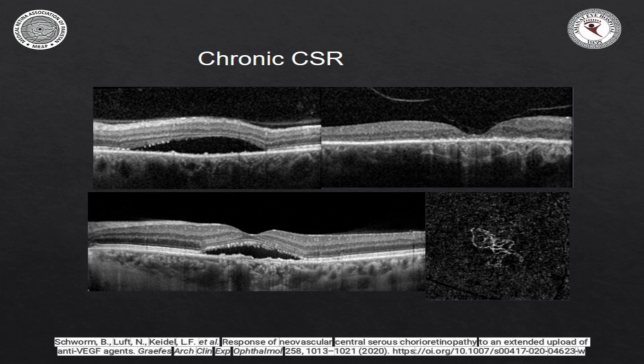And then you've got, okay, ठीक है, RPE irregularity भी मुझे नजर आ गई. In a patient with chronic CSR, be very, very mindful if this is not a developed CNV. So we know that chronic CSRs do develop CNV. They present to my clinic more often than I'd like to. And if you do a fluorescein, and for me, this is one of the very few true indications of getting an OCT angiography done. Because अगर इस पे आप fluorescein angiography करेंगे, तो you will get that subretinal hyperfluorescence leakage anyway of an active CSR. And it's hard to differentiate that between a chronic CSR and a CNV.